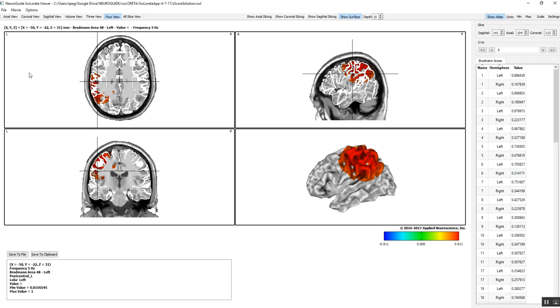There's a number of features I'm going to be able to show because, as I designed this, I tried to maintain some continuity with the 2001 LORETA viewer at the Key Institute, put together by Roberto Pascual-Marqui. It's a fantastic program that's been around for 15 years, and there's hundreds of publications.